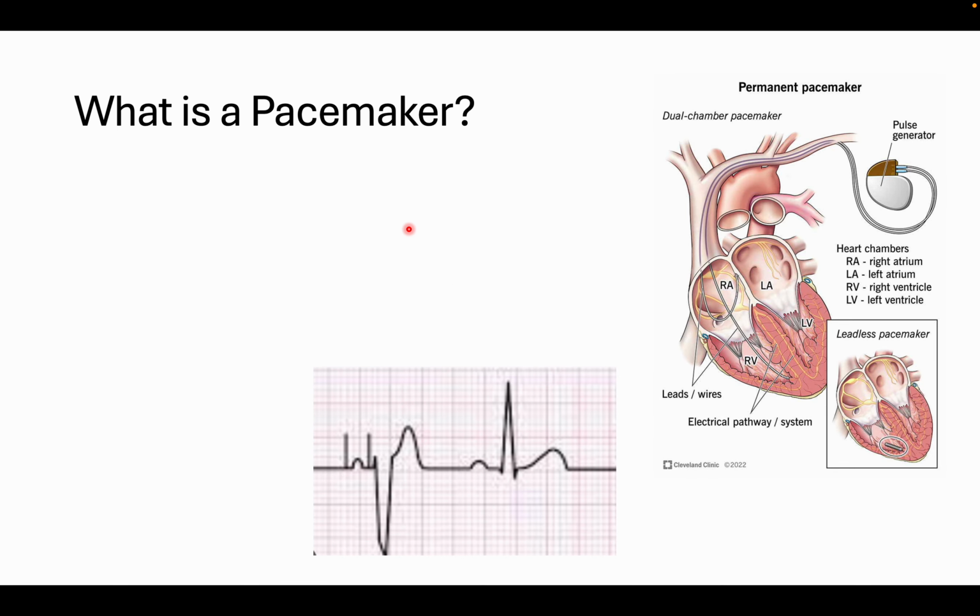ECG Crash Course. Today we'll be going through the basics of pacemakers. So what is a pacemaker? A pacemaker is an electrical device that is used to treat bradyarrhythmias, so whenever the heart goes slow.